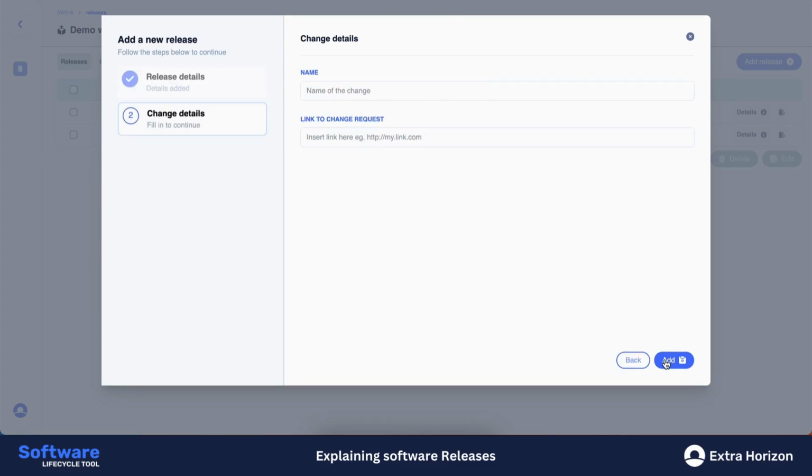As always, each new release consists of a body of work that your development team is going to work on. So, for example, for this release, we want to add a single sign-on flow, and that change has been approved in the upper lying change request according to the 13485, for which we can add a link here.